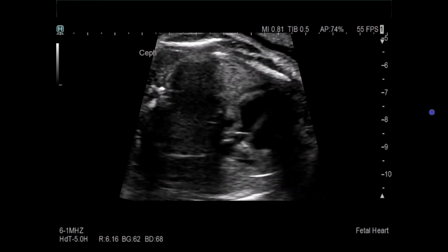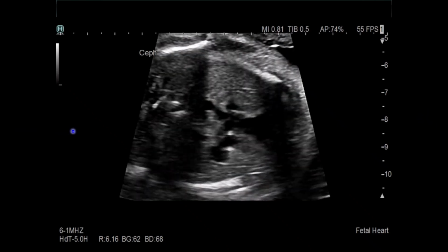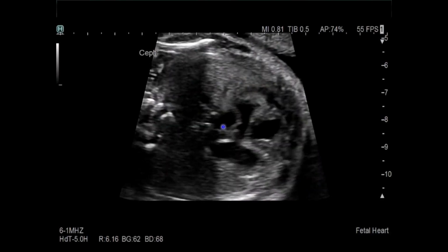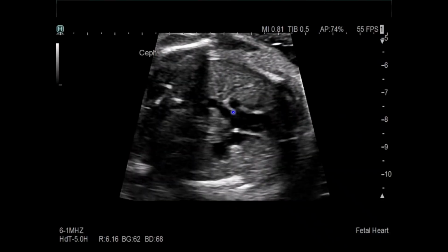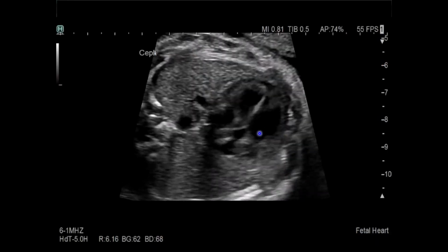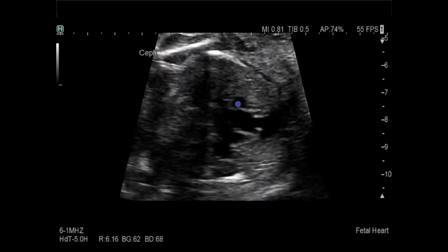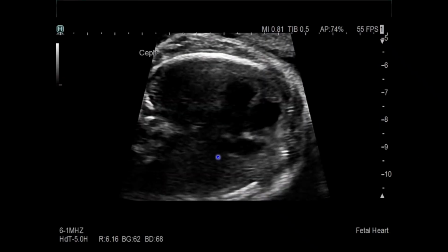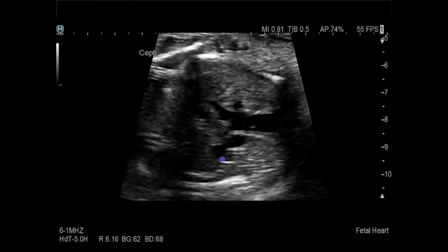This is another case of an abnormal appearing vessel, fourth vessel in the upper chest. Here we can see from that four-chamber view, outflow tracts. This is the spine. We're seeing four vessels here. So again, levocardia, left side over here. There's left vessel, PA, aorta, and the right SVC is over here. One more time, there's the right SVC.